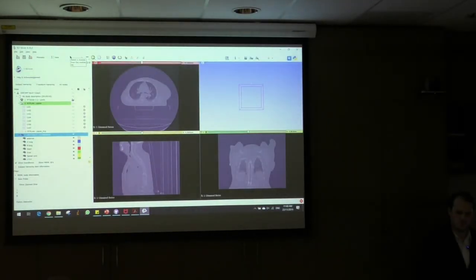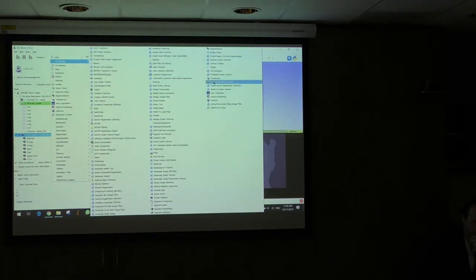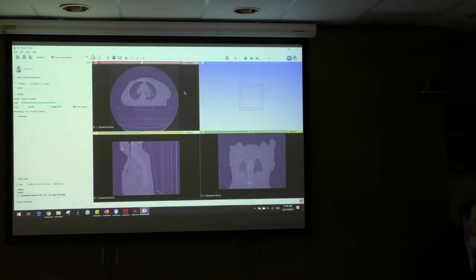So we'll start with the volume rendering component. What that is, a module, as shown before, and we click on the volume rendering software option. And this gives us a sort of workflow on the left. It changes our data. And what we can see here is different volumes that we can select. In this case, we want to select the CT scan.